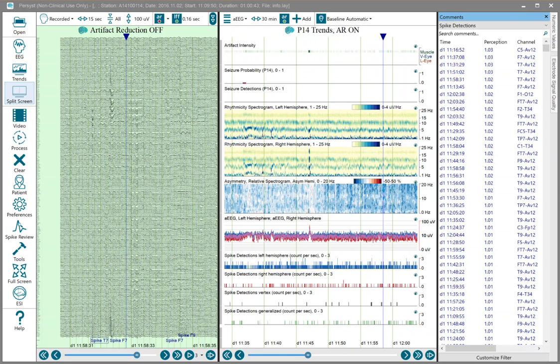Hello, this is a 256 channel scalp EEG recording. It was performed with an EGI system, and this is opened in the native format in Persyst. And this is a very short ad hoc screencast just to show how to apply a channel map and how to process the recording in Persyst using settings for 1010 and 1020 channel maps, specifically for the EGI recordings.